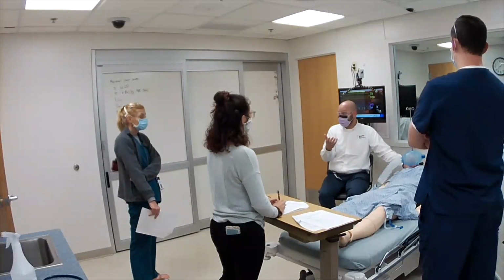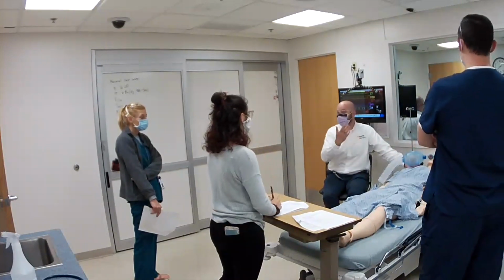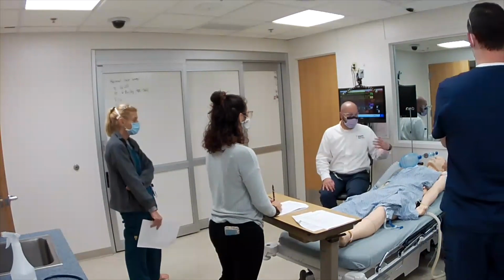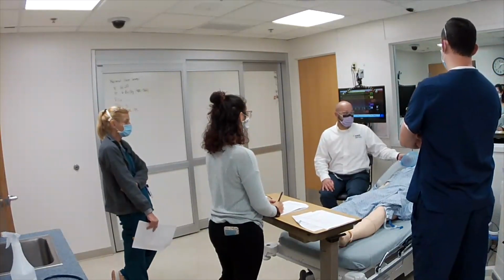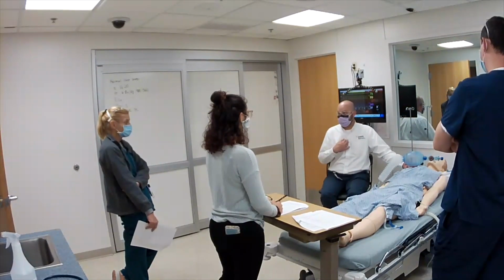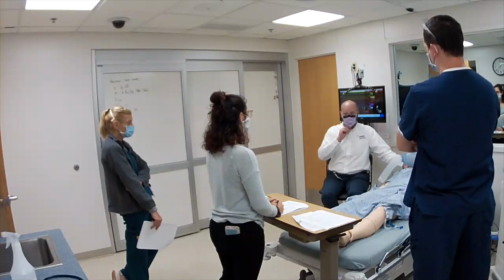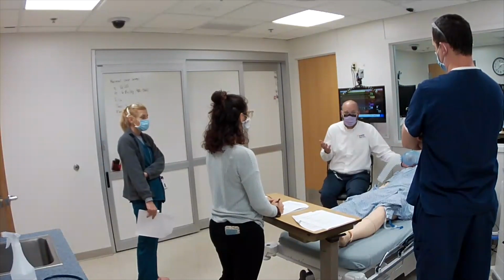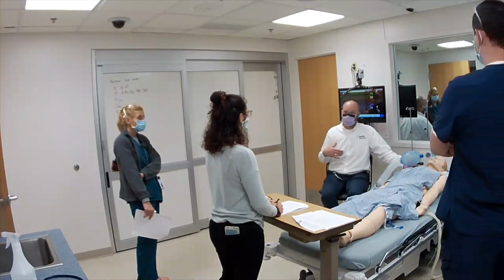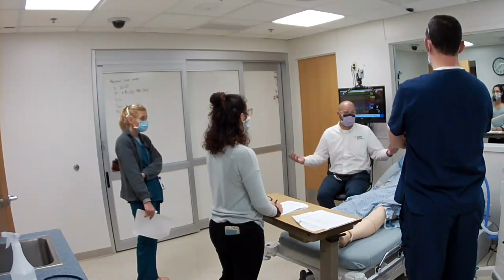It's also a lot of peace of mind for our providers in the background because I know they're going to get the minimum that I set. So I'm going to set a minimum that they have to get every minute, and they're going to get that because the vent's going to make sure they get that, right? Versus pressure support or CPAP, maybe they get that, maybe they don't, right? So it helps them be able to breathe on their own, but also still gives me the confidence that, yeah, if they quit breathing, they give up, the vent just takes over and does its thing, right? So it's a really nice mode of ventilation. So there's a couple of versions of SIMV here. So you have one volume control, one pressure control, one PRVC, but those are just the underlying vent settings, right?